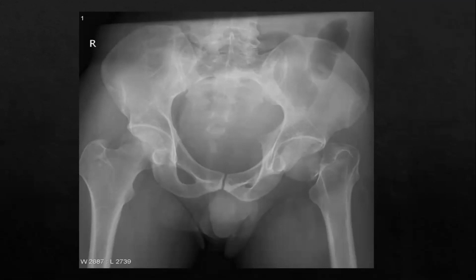Sure, I'll give it a go. Brilliant. Is that Aaron? Yeah, everyone's fine. So this is an AP X-ray of the pelvis of an unknown patient. I assume it's an adequate X-ray. The main concern that I see right now is a left intracapsular neck of femur fracture.